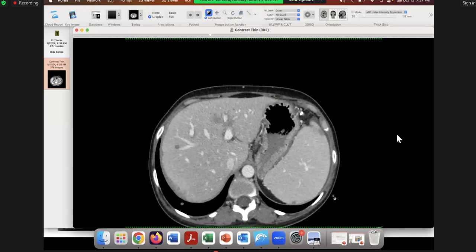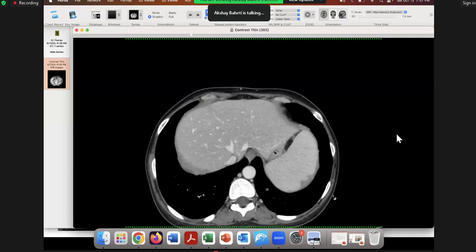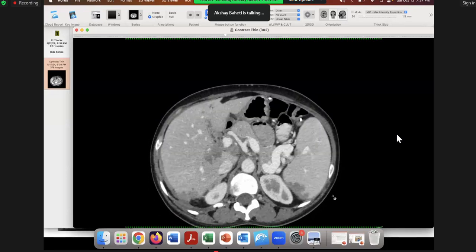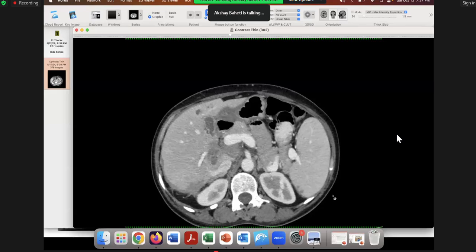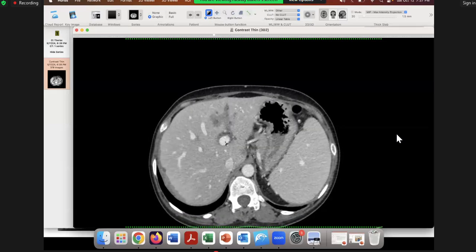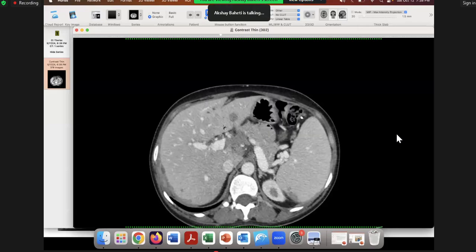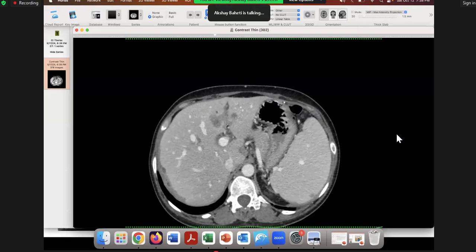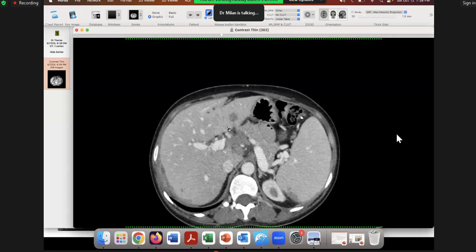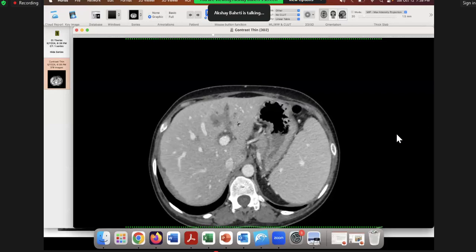Very good. I like your confidence. There's one thing in answering correctly and one thing in answering confidently. I think both are very important, and you are answering very confidently. I'm glad to hear that. Okay. The one thing which I would disagree with is that this is still surface, because this is falciform ligament, right? What is here is falciform. Yes, sir. Deposits along the falciform ligament can then invade the surface. That is fine. So this is still for me surface deposit.